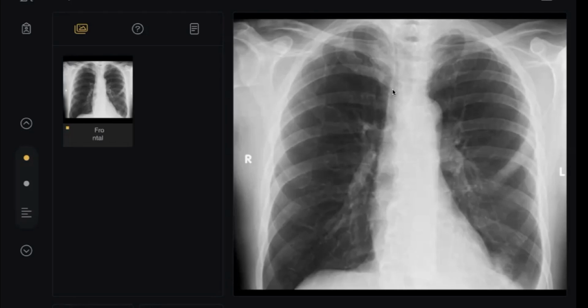Doctor, where is your area of concern? Left lower lung zone. No. What else? Both lungs show normal inflation, don't worry about the lung. What else? The sclerotic rib. Where? This fifth anterior rib on the left side.